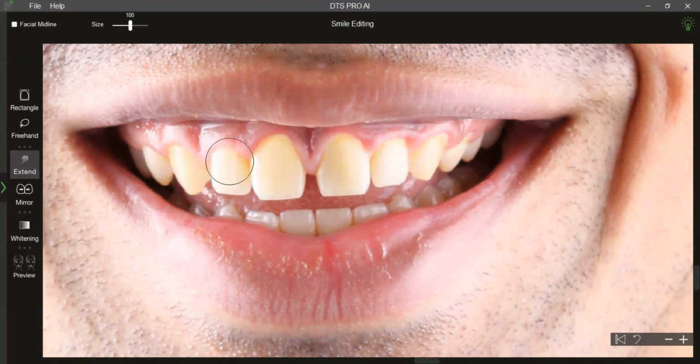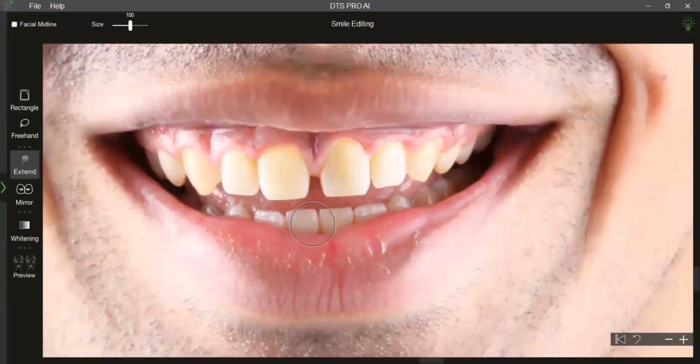So that helps me in simulating any crown lengthening changes. As you can see, this particular patient shows some boggy gingiva. Of course, the deposits add to the bogginess of it, but you can use the simple tool to present and make the patient understand the crown lengthening changes. If you want a little more finish, you can control the size of the brush on top there, and that is good enough for me.